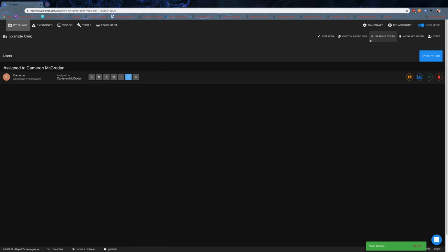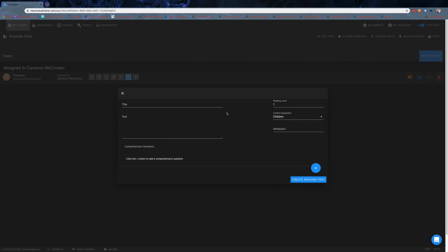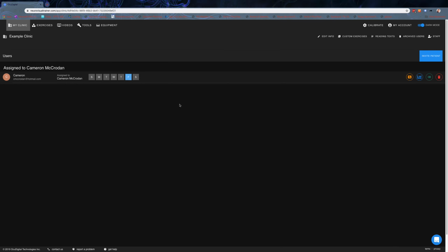The last sort of custom thing to this, which is super handy, is the reading texts. So with NeuroVisual Trainer, we can actually upload and create our own reading texts. So you can, again, put in a title, put in the body of the text that's to be read, add the comprehension questions, choose a reading level, choose whether it's adults or children. And then for attribution, you can also say where that reading material was sourced that you put in there too. So there's some preloaded reading material, but that's a really handy way to be able to add custom stuff, for people to be able to add articles that they want to read, all sorts of things like that too.